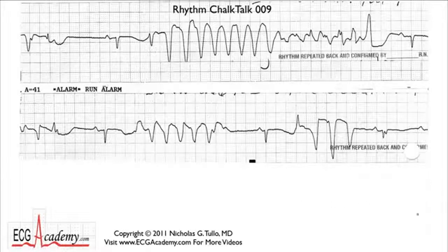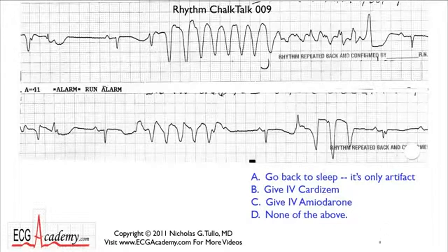And here's the rhythm strip they give you, and here's the question. What do you do? Do you A, go back to sleep, it's only artifact? Do you B, give IV Cardizem? Would you C, give IV amiodarone? Or D, none of the above? So let's get to it.